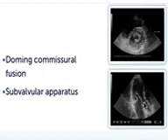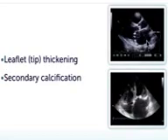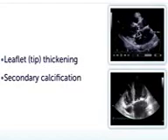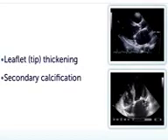We also see very thick chordae tendineae. We have thickening of the subvalvular apparatus, which also involves the papillary muscle. Furthermore, we have thickening of the leaflets, which are usually more prominent at the tips, but can also affect the entire valve. And especially in older patients with mitral stenosis, we find secondary calcification.